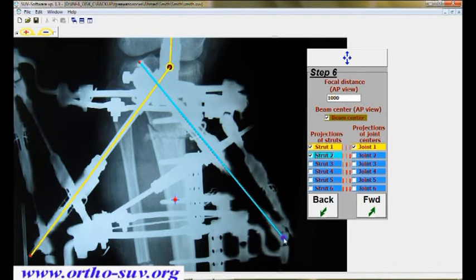Now we mark strut number 2 and we drag the line from down till up. For struts number 2, 4 and 6 we have to draw the line from down till up because they have the joints fixed to the distal ring, even when we don't see the joint. Then we mark joint number 2 and we align the joint. Now on strut number 2 we see the joint very properly, so we can align it not only by the lines but also by dragging the center of the joint's symbol.